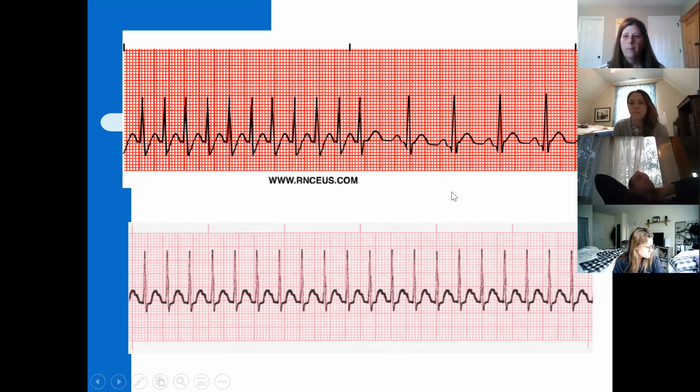Does that help you now? Yeah, that makes a lot more sense. Okay. Yeah, this manufacturer, I don't want that to trip you up. This manufacturer just decided to put one in every 1 second.